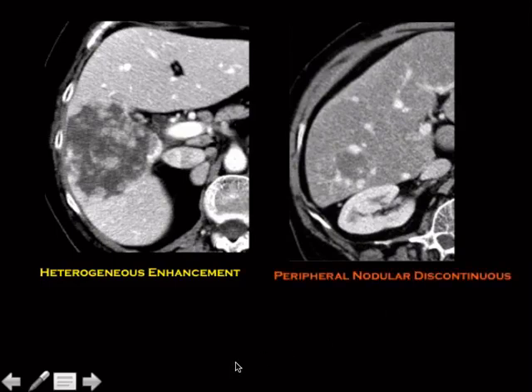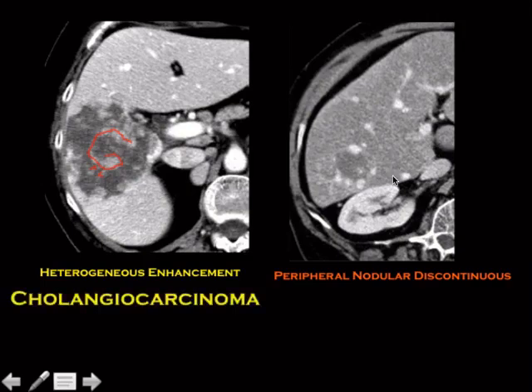All right, so this was our case. This stuff's not supposed to be here. You can't have that in there. The stuff on the outside's okay. So here's a hemangioma, right? That's all right. That's cholangiocarcinoma. It's not always at the hilum. It's not always at the hilum.